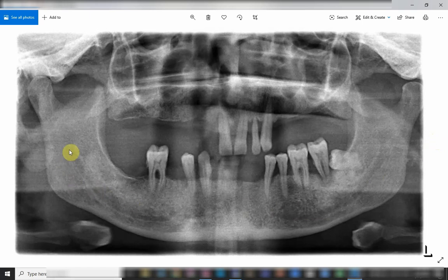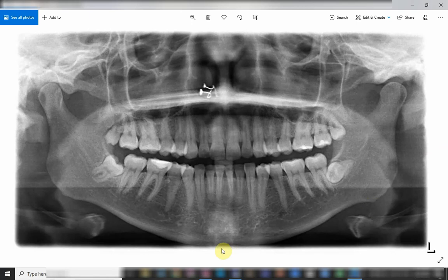See, in this radiograph again the course is similar, and then it goes back again, and you can see here that there is a long distance between them. This is the mandibular foramen, then it goes downwards and then anteriorly and then it loops back again. See the relationship here; this is not the mental foramen, by the way, this is the mental foramen over here. So again, the appearance differs from one person to another.